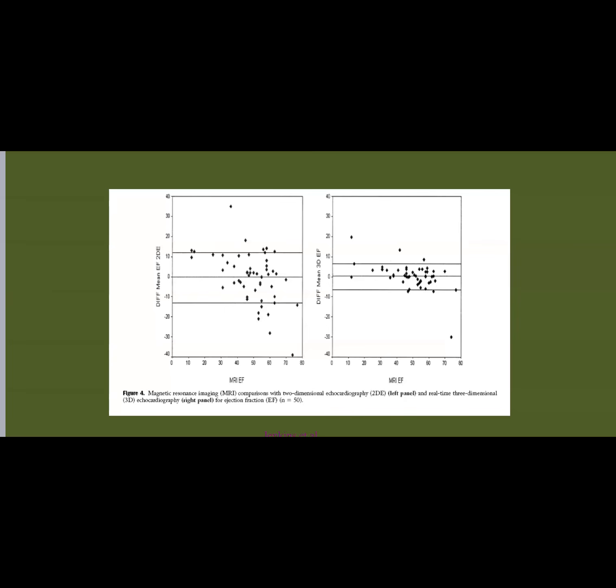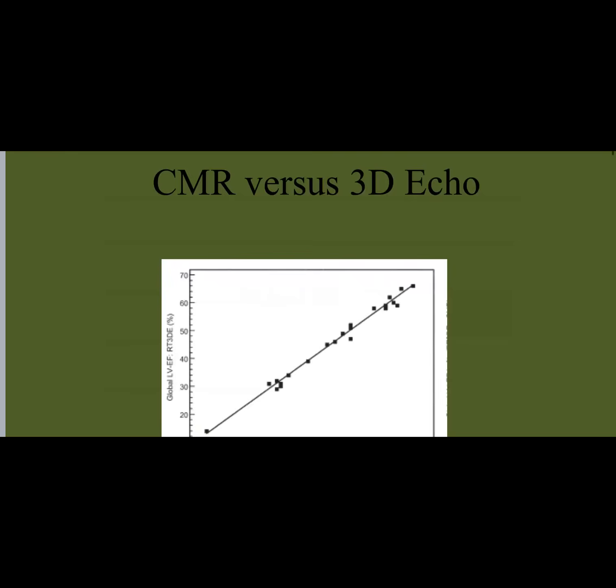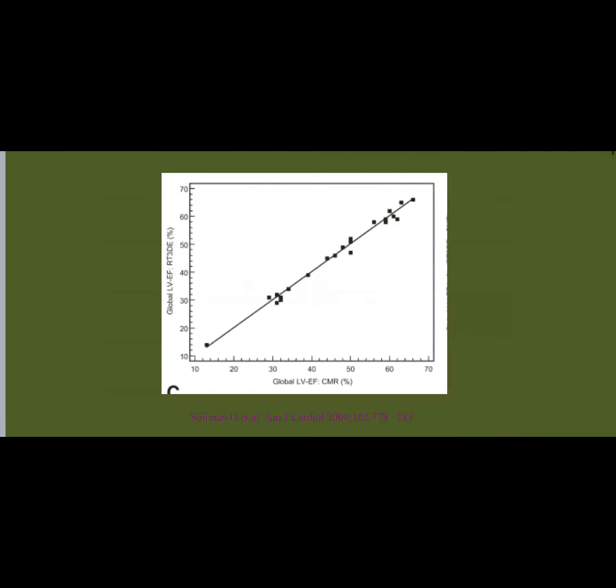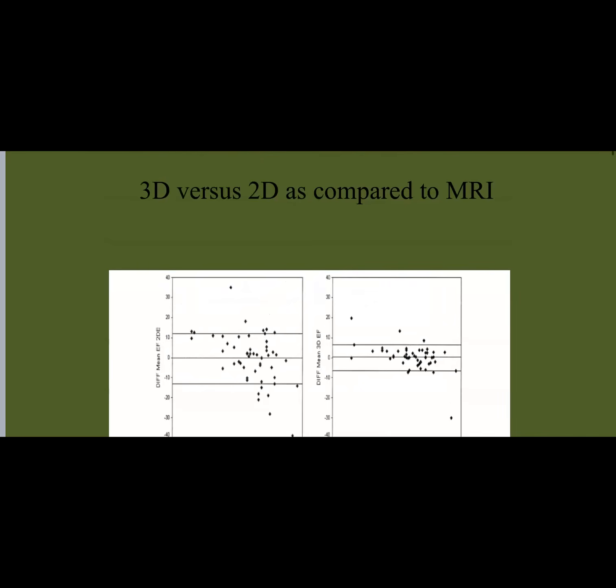We are still far from it. But as the technology improves and it becomes more objective, more reproducible, easily accessible, ubiquitous, everybody can do it, 3D echo ejection fraction is going to replace the 2D ejection fraction. And this is again CMR versus 3D echo, and you see the correlation. It's so nice. Okay, again, this is the same one.